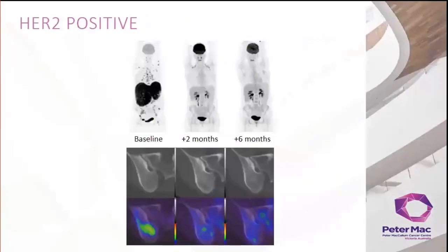This next case is HER2 positive disease. This is primary staging. This patient presented with severe right upper quadrant pain and had an ultrasound performed in the emergency department, which showed widespread disease. Biopsy was done, and this proved metastatic disease from a breast primary, which was subsequently located.